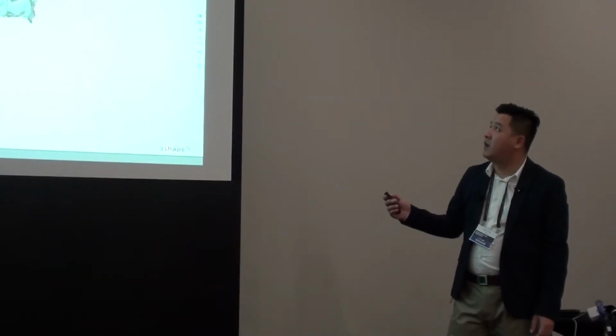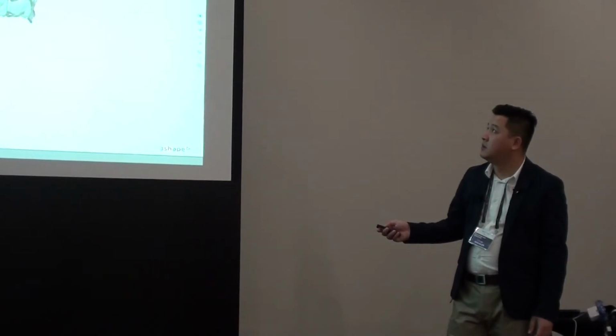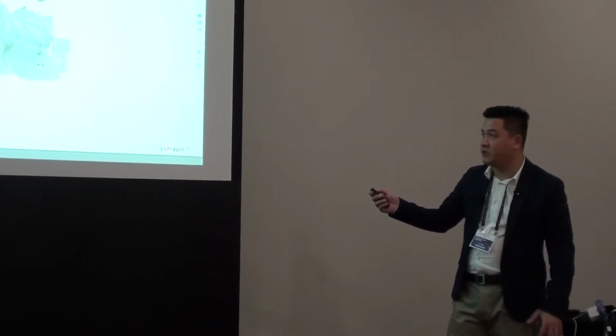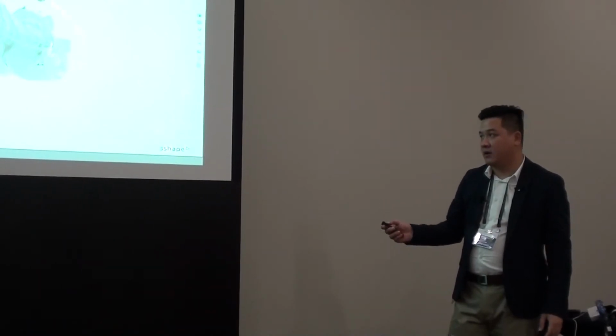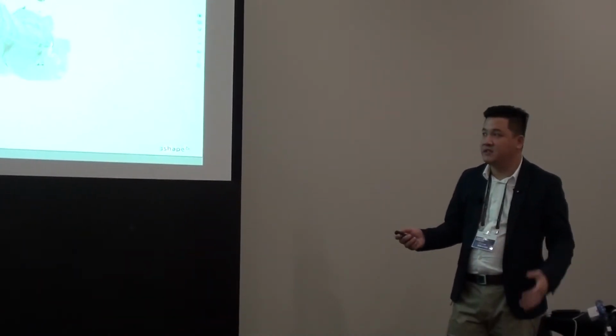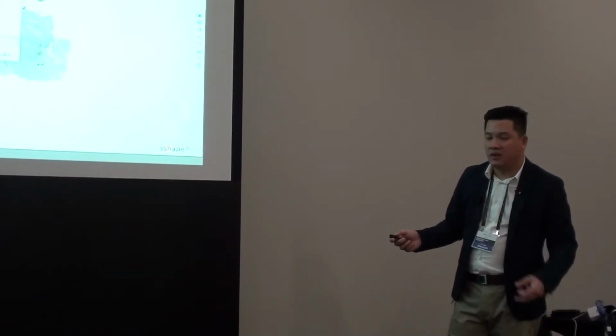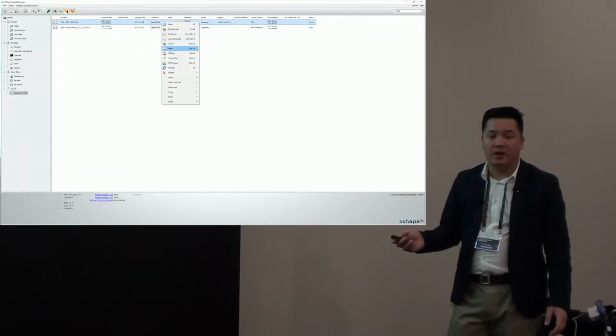And then we move on to the Save Scans tool. I'll skip over that. We see these are in alignment now. We're happy with where everything's ended up. So we go here, save. We check this little box here that allows us to save that additional information, which is the new alignment. Then a file dialog will come in, and you just save it as an easily recognizable name. I use the same name as the patient, and then just "aligned," and that's how I know.